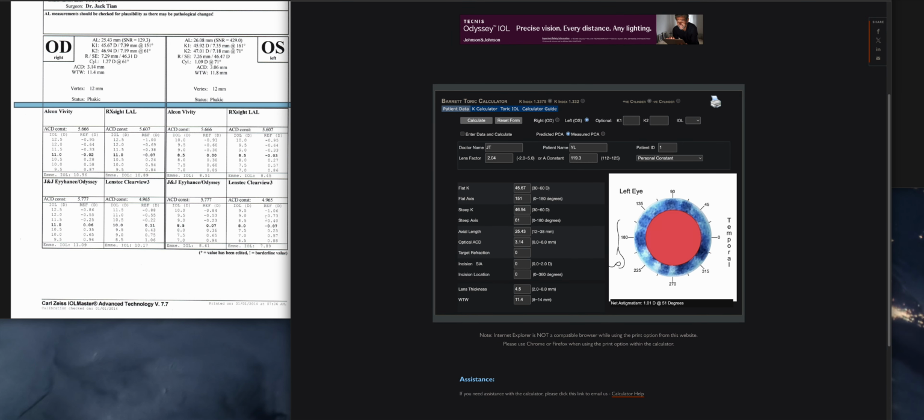Let's bring that on over. 45.92, 47.01. Whoa, that's pretty steep. 71, 6.8. All right. We're gonna calculate.